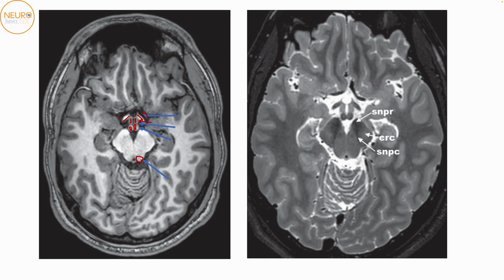The slightly hypo-intense structure separating the crus from the tegmentum is the substantia nigra, which you can also see on the T2 image. Here, this hypo-intense structure is the substantia nigra. Similarly, this hypo-intense structure is the optic tract. This is the mammillary body, and this is the hypothalamus. These will be your ACAs running over here, while this in the Sylvian fissure would be your MCA.